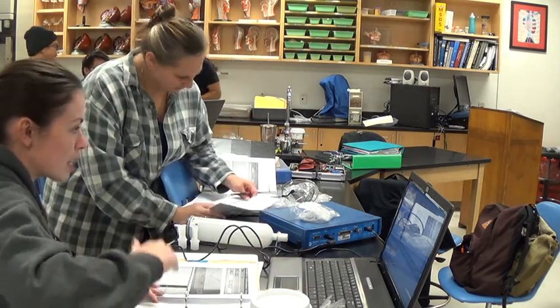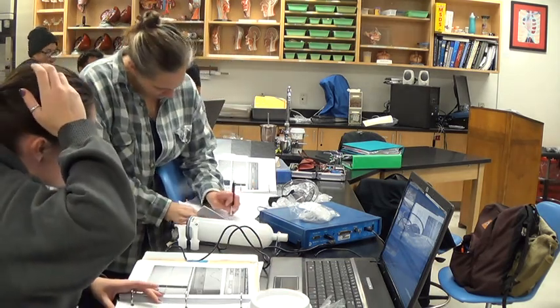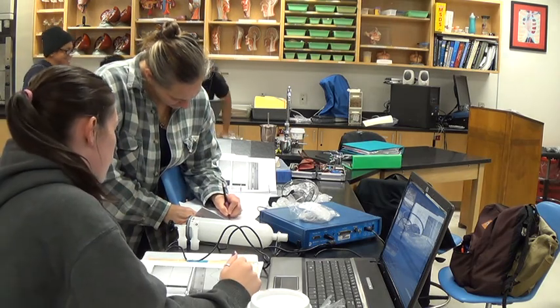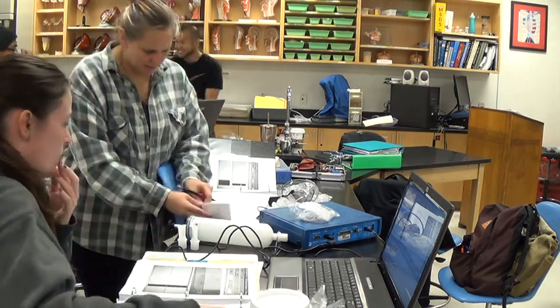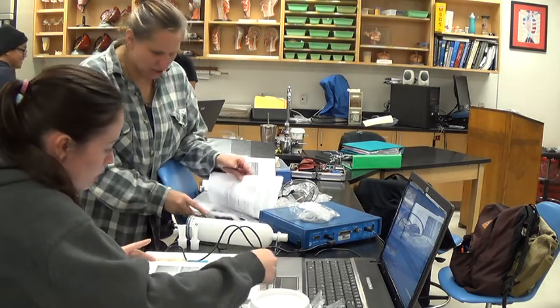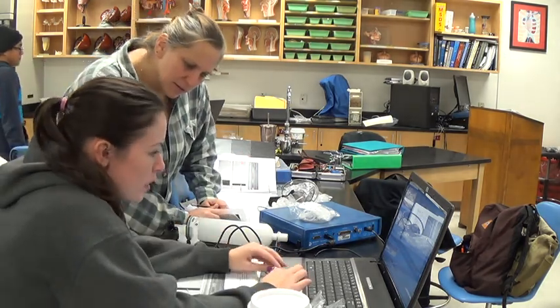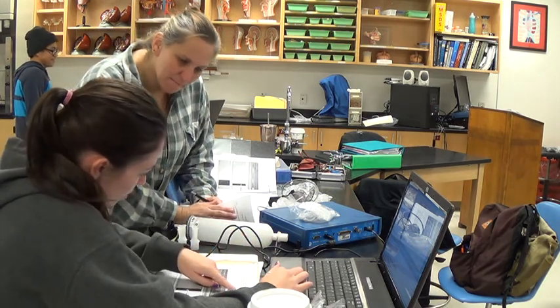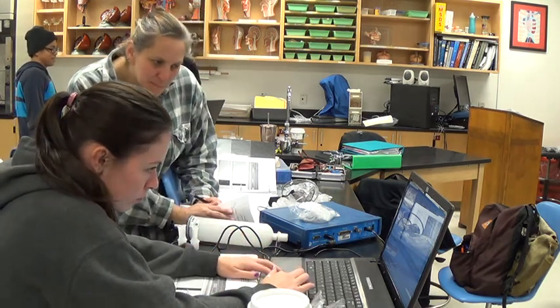So for vital capacity... How can you have a negative? And then tidal volume is going to be the same thing. Well, our thing was kind of low. Remember, she didn't care about the negative on here, so maybe it's supposed to be.